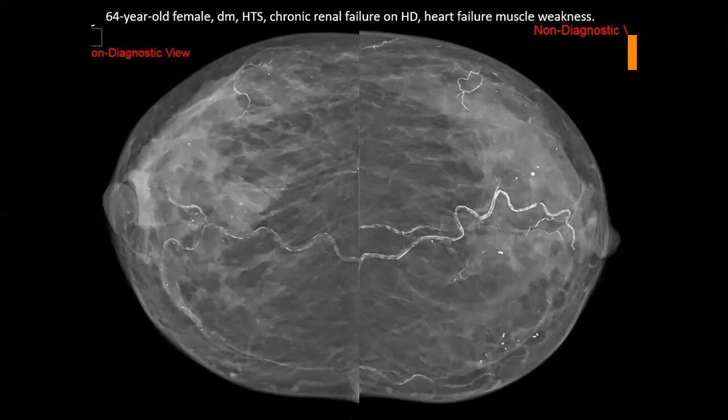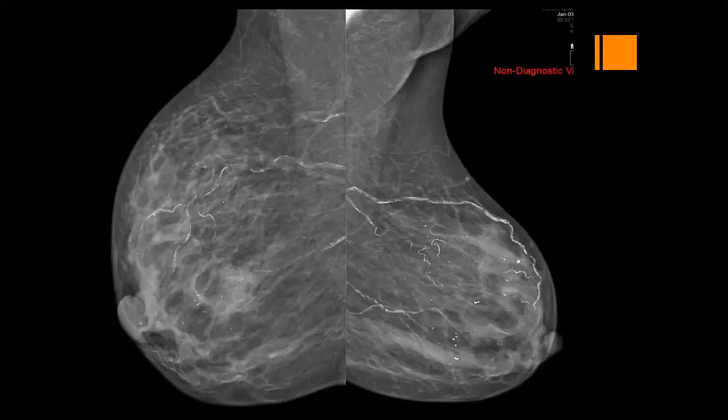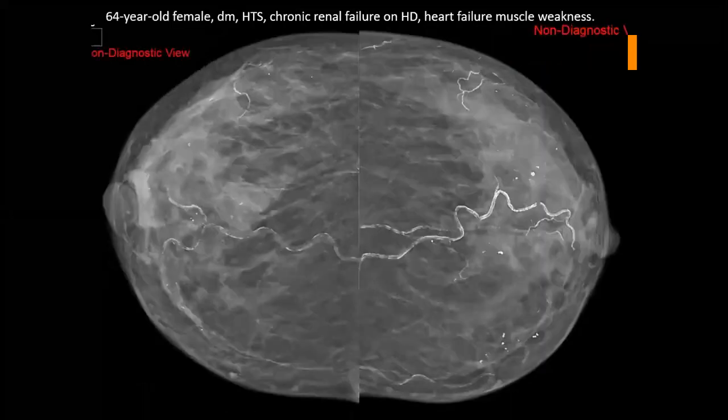What else other than retraction? Compare it with the contralateral. It is larger, edematous, enlarged. The right nipple is enlarged compared to the contralateral. So all these are relevant features, suspicious features.